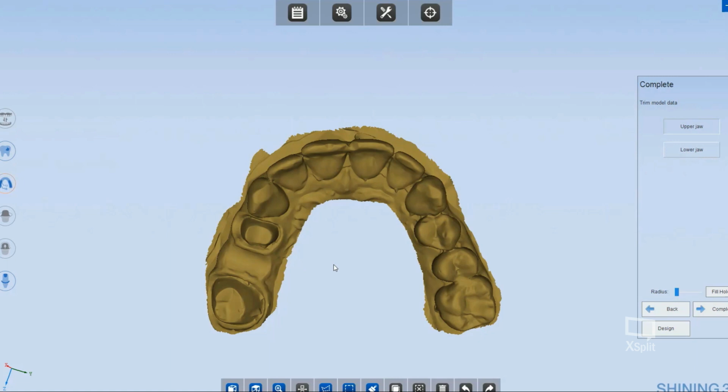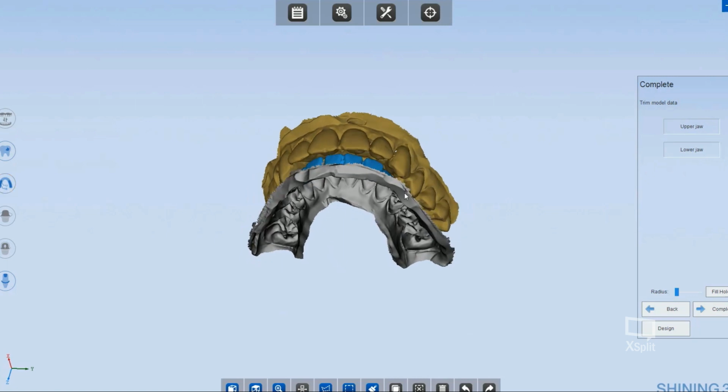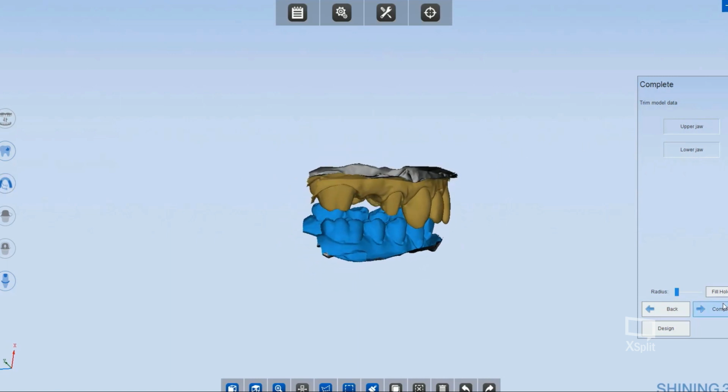Obviously, if you want to obtain a perfect final mesh, you can select and highlight the whole point cloud, let's say, when you add acquisition in an intelligent way. Okay, this is done. The two models are in a perfect position, in a closer position, and now I can press complete, because this job can be considered as completed.